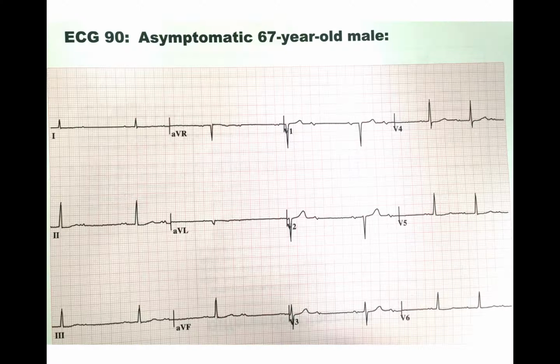Next thing you want to do is figure out if there's a P wave for every QRS. And it seems like the rhythm is coming from the P wave, because we have a P wave here, a P wave here, QRS, P wave here, P wave here, QRS, P wave here, and a QRS. And it continues so. So the main rhythm is coming from the atrial side, and therefore we can call this sinus rhythm.